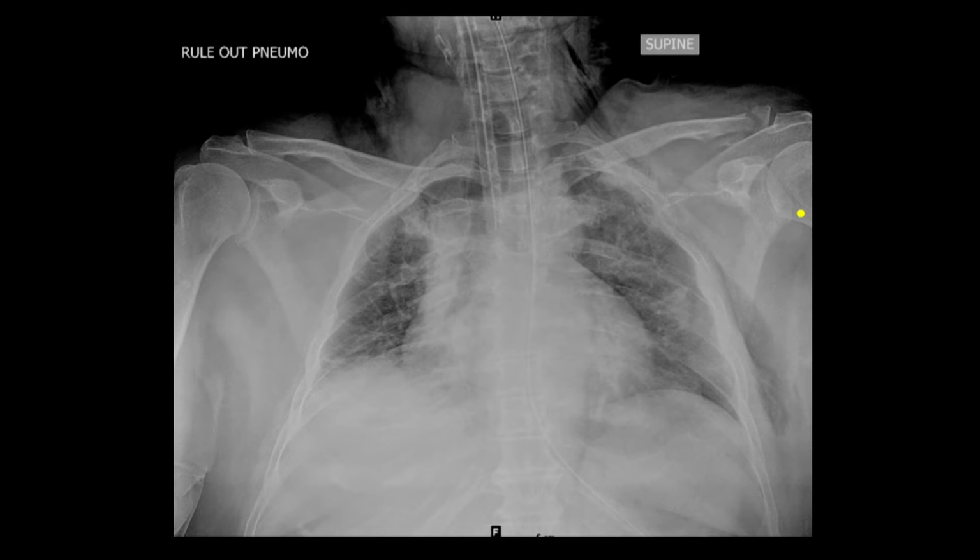In this patient, again, the patient's intubated, and you can see that the tip of the ET tube is less than 2 centimetres above the carina. The carina is in this area here. You can see a fairly obvious fracture here of the distal clavicle on this side. And again, when you're looking along the chest wall, you can see that the patient has subcutaneous emphysema, and the subcutaneous emphysema in this example is extending up into the neck. You can also see some subtle pleural thickening here, which is highly suspicious of rib fractures. So again, you're seeing some fractures of the ribs here along the lateral chest wall.